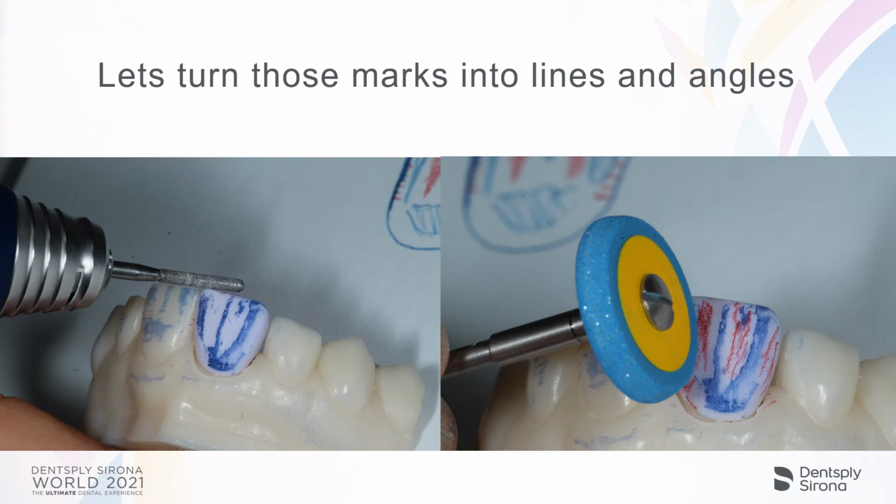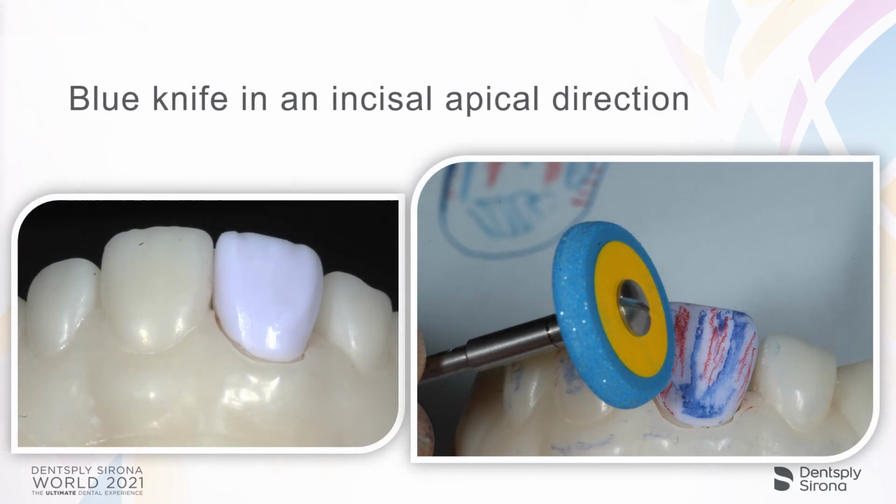Then what I'm going to do is once I've removed that sprue, probably about 90%, we're going to go back and turn all of these little marks, our topographical markings, into something with our blue knife wheel. So our blue knife, we're going to use that in an incisal to apical direction, and we're going to try to stay off of the blue areas that we've marked on the tooth when we utilized our method of articulating paper to mark our heights of contour.